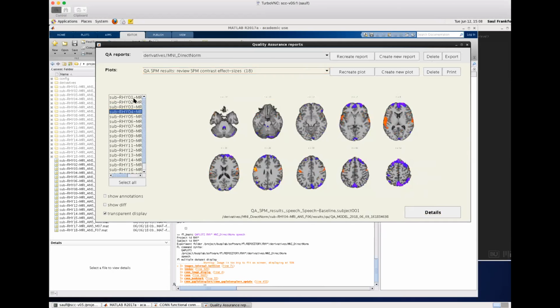This looks a little bit strange, but not terribly so. It's still showing activation in the central sulcus and temporal areas. That looks fine, and the negative activation looks fine as well. This is the subject that didn't show. Oh, yeah, we already saw this guy before. Intermediate, not terribly worrisome, but it's fine. That looks perfectly fine. Yeah, that's fine. Yep, that's also fine.